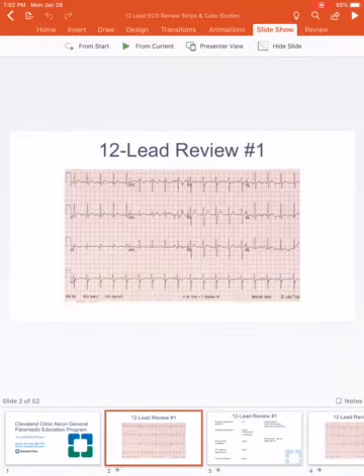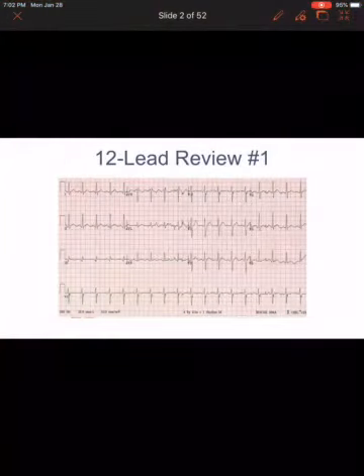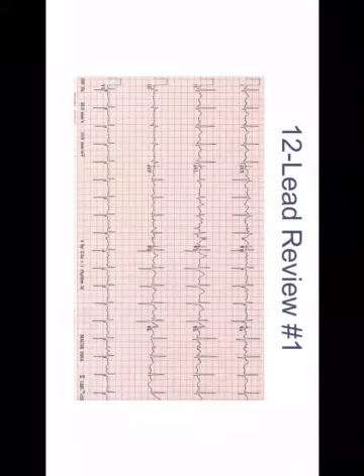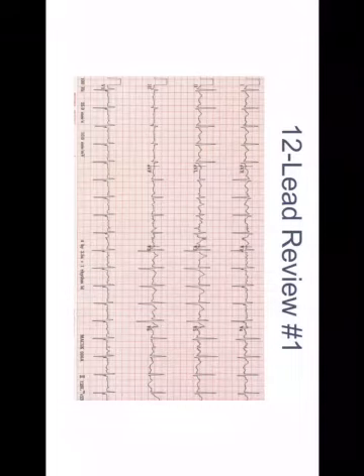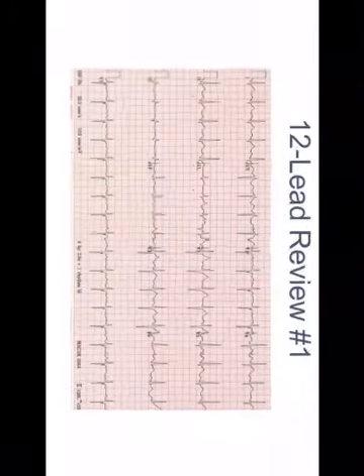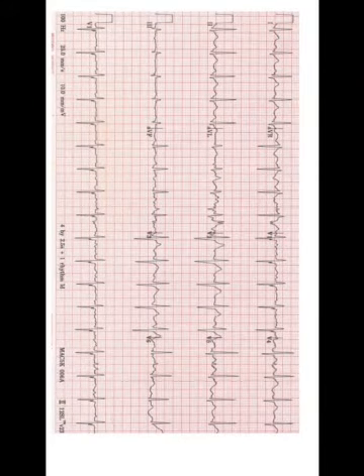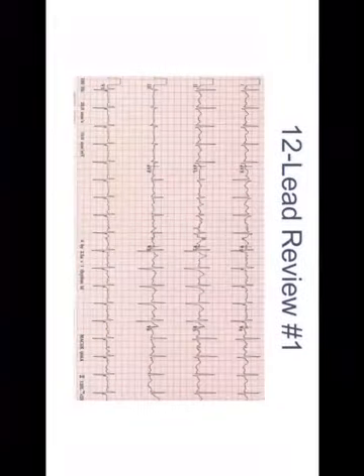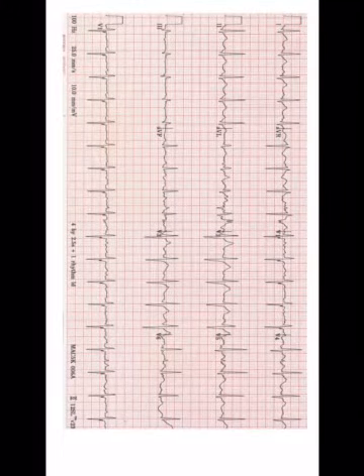So let's go ahead and get started here. I'm going to do my best. This is my first time using this application to capture the screen, but hopefully it'll work for us. And bear with me as I switch back and forth between screens and between using the pen function to draw on the 12 lead and going back and forth between the slides. So here we are on 12 lead EKG 1.